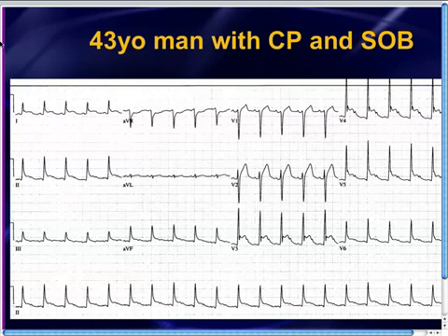And in this case, we'll take a look at lead V3 just for the heck of it. Lead V3, there's definitely a P wave there, and then there's something there, and I don't know what that is, and then there's a P wave, and there's another question mark there. Well, if you want to know whether those are P waves or not, what you simply do is you get your calipers and you map it out, and if they map out regularly, then you have to assume that those are P waves, just like we established last week. And it turns out that when you map these out, they do not map out. So those are not extra P waves.